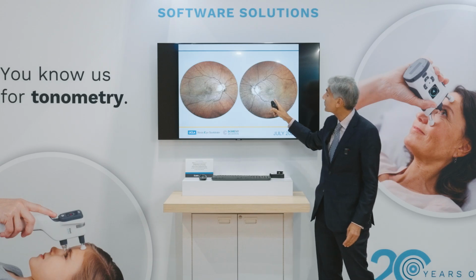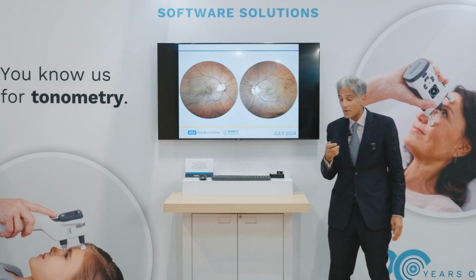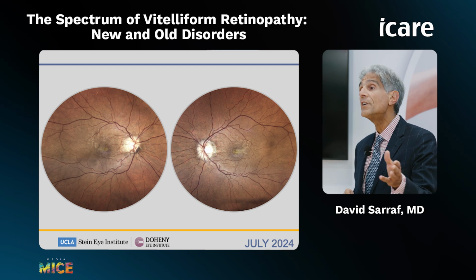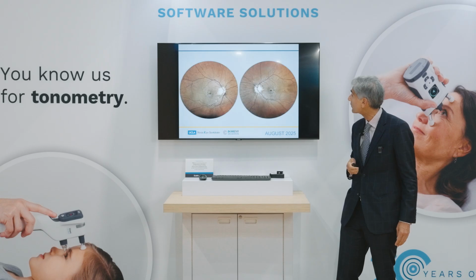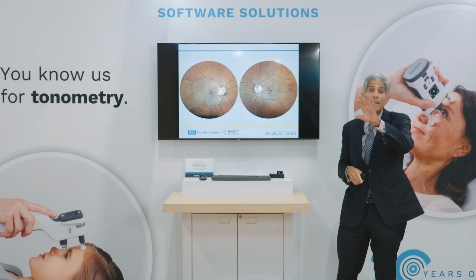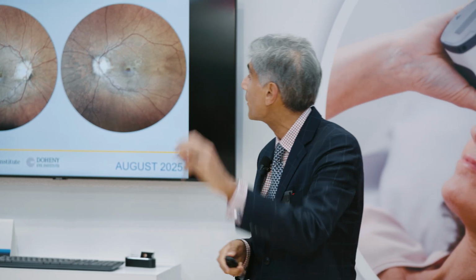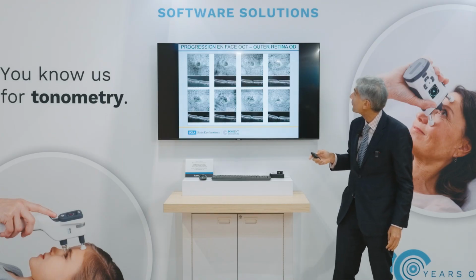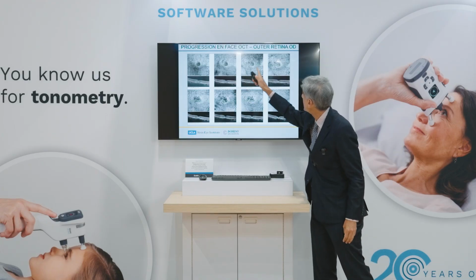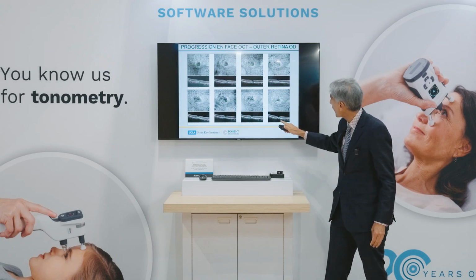This is the same patient that I showed you at baseline, showing the vitelliform lesions, the angioid streaks. We've been following this patient now for many months, 2 to 3 years. The vitelliform lesions have now evolved into this maculopathy with pigmentary changes. And on the en-face OCT, you can see the evolution of the vitelliform lesion both on en-face and B-scan.